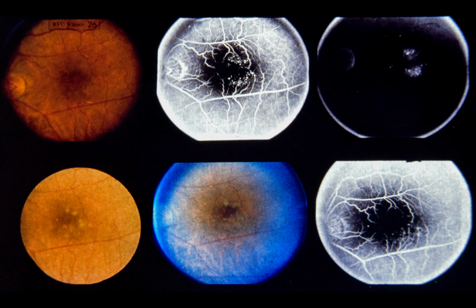Comment: this patient had a favorable prognosis for improved vision following photocoagulation because of the following factors. Visual reduction was modest. There was no lipid in the central fovea. There was good parafoveal capillary perfusion. Leakage sites were clearly identifiable on the fluorescein angiogram.